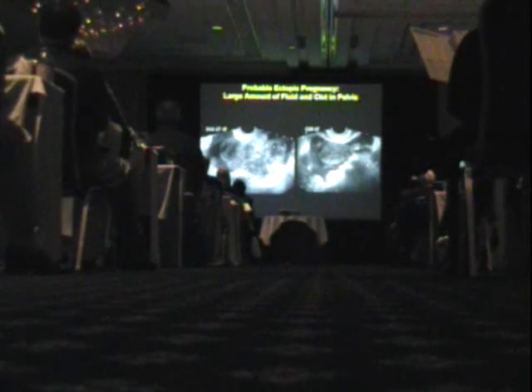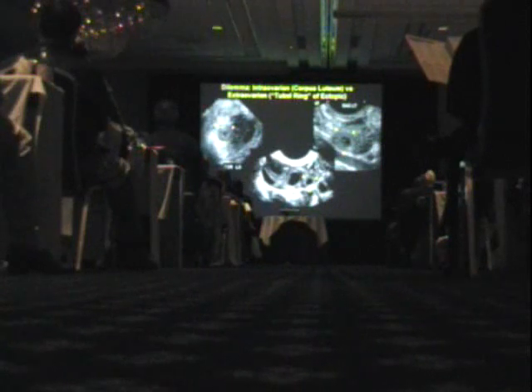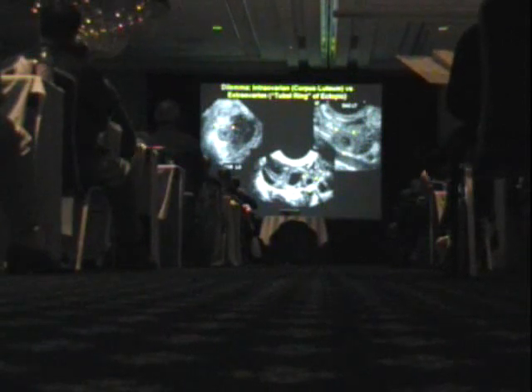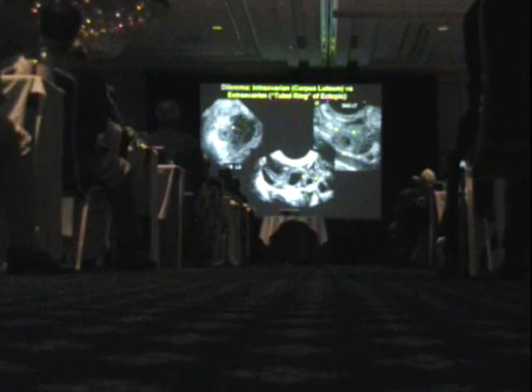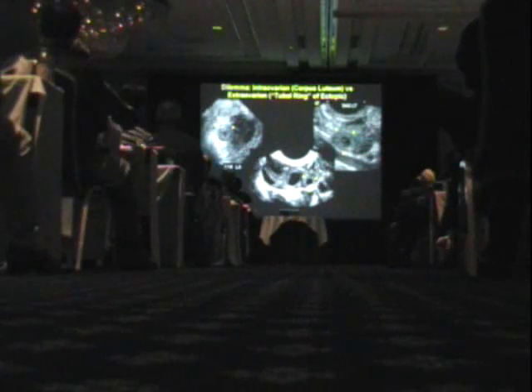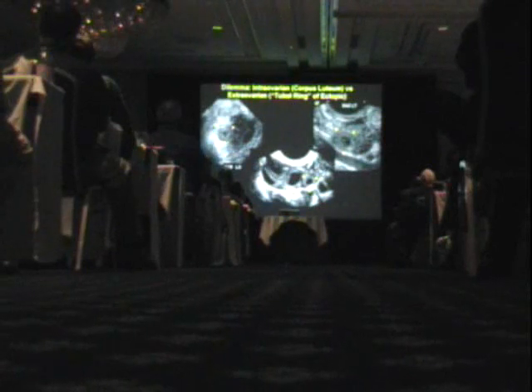In this clinical setting, positive pregnancy test and nothing in the uterus, and pain and bleeding, very high likelihood of ectopic pregnancy. So I mentioned that lesions inside the ovary are irrelevant in a rule-out ectopic patient, in any patient with a positive pregnancy test. They're just corpus luteum. Ones outside the ovary are very important. They indicate an over 90% chance of ectopic pregnancy.